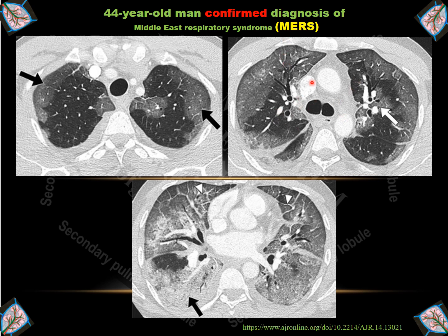Another patient with ground glass opacity. For a patient with confirmed diagnosis of MERS, we see upper lobe subpleural distribution of ground glass opacity. Also, there are pleural effusion and thickening. There are peribronchovascular distributions, areas of consolidation, and interlobular septal thickening can be detected also.